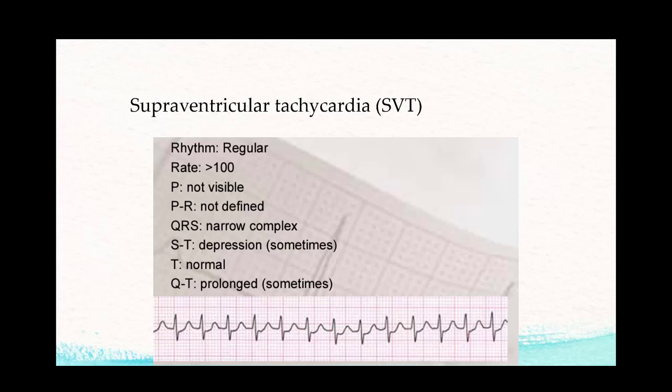When we start getting into supraventricular tachycardias, we're getting into stuff that isn't always normal. So with an SVT, that's the reason it says rate over 100. 100 to 150 is typically going to be sinus tach originating from the SA node. Over 150, that's really when you should start calling it a supraventricular tachycardia.